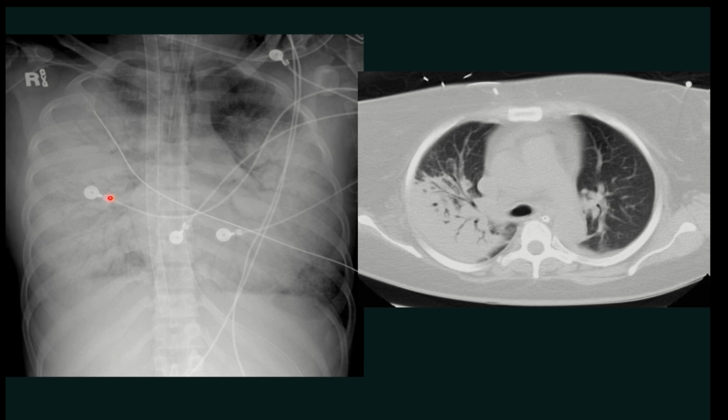This usually happens because the air spaces around the bronchi are filled with fluid, interstitial edema, and all the alveolar spaces which are usually patent and filled with air are replaced with fluid. So this is the basic pathophysiology, the mechanism of how the air bronchogram sign is seen. As the age of the consolidation progresses, these bronchi are filled with inspissated secretions, and later on the homogeneous opacity is seen. These tubular lucencies are lost over a period of time. It still remains consolidation, the diagnosis remains the same, but the stage has changed.